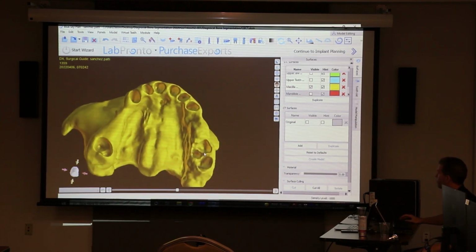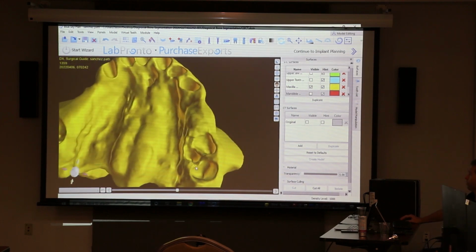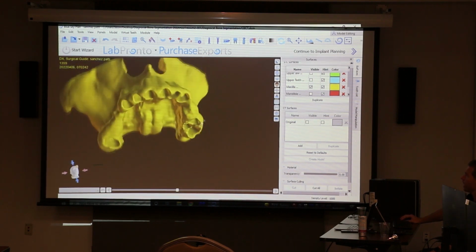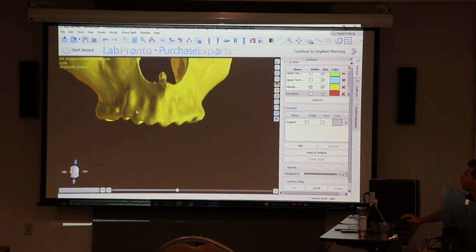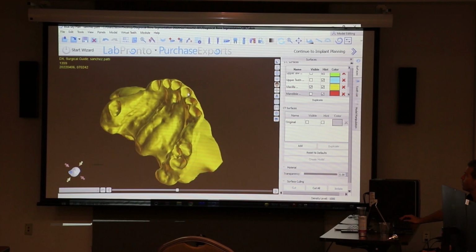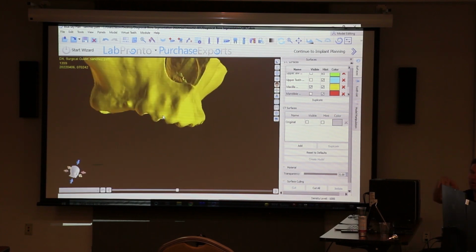And then same thing with your multi-rooted teeth. You can visualize your furcation. Really pretty impressively accurate for what it does, 10 minutes just using AI. But you could go print this model. You could do mock surgery on it. You could try your guides on. You could make bone reduction guides on it. So I could build a guide over this and actually trim it where I wanted to reduce my bone. And you can build a guide that snaps on that when you're doing your bone reduction, you can just take your burr straight across and be really, really accurate with everything.